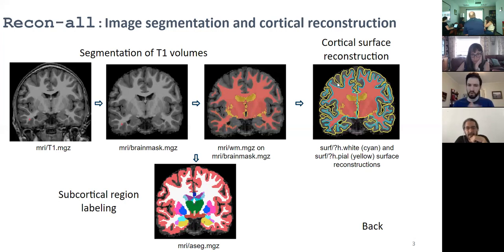They also claim that for most of the analysis that we're doing, besides morphometry, so if you're trying to localize, or doing functional MRI analysis, or generating ROIs for any sort of analysis, the actions in this more interior portion of the cortex don't really matter as long as you're getting all the way out.